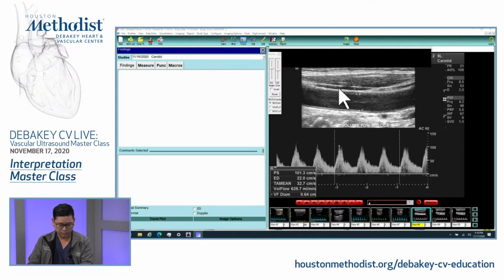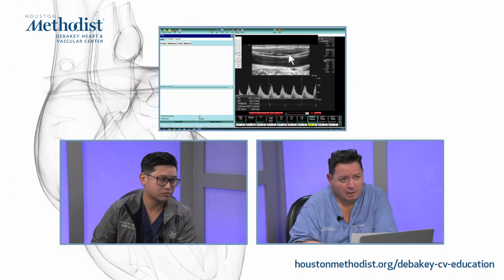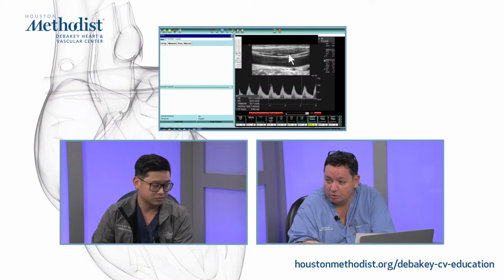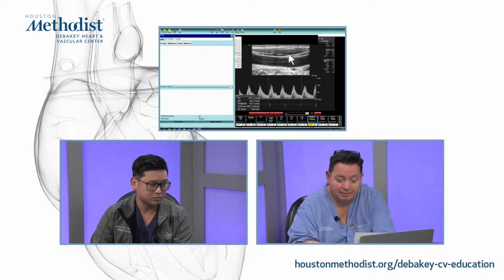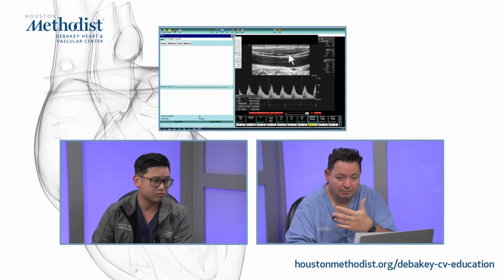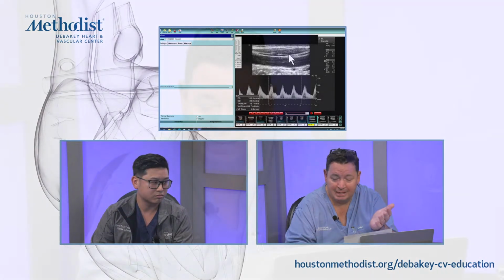So, Dr. Garami, what's a fair amount of volume flow which is significant to you? I think we pulled some reference papers, and 400 to 800 would be a normal range. But if you have a drop of half, that's a significant difference. So this is why we are pulling up the volume flow, that if you have, for example, a bilateral 70% stenosis, which side you want to attack first with intervention, surgery or stenting. Right. So this way, the volume flow tells you which is the side of the recipient of the collateral flow.